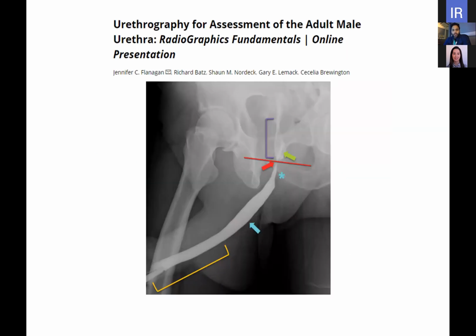So does anybody know what study this is? Not many centers do studies like this, and certainly you can get a lot of information from performing things like this, especially when you're trying to answer specific questions.